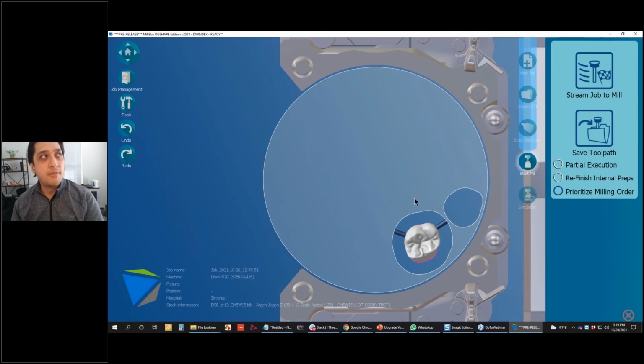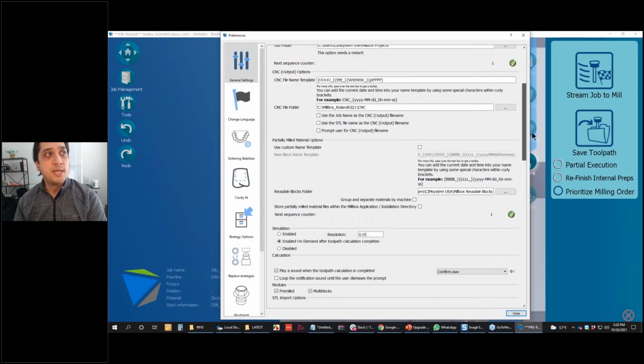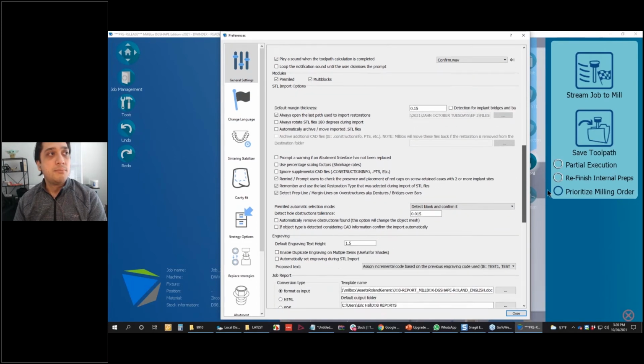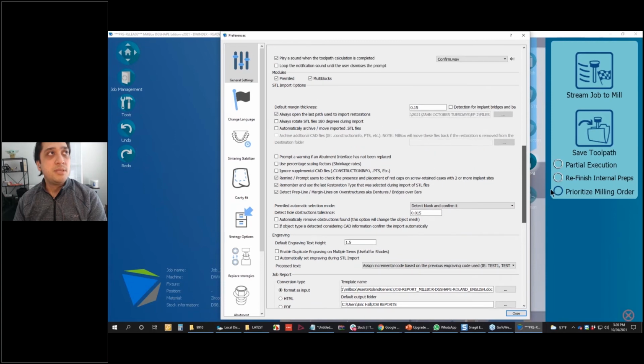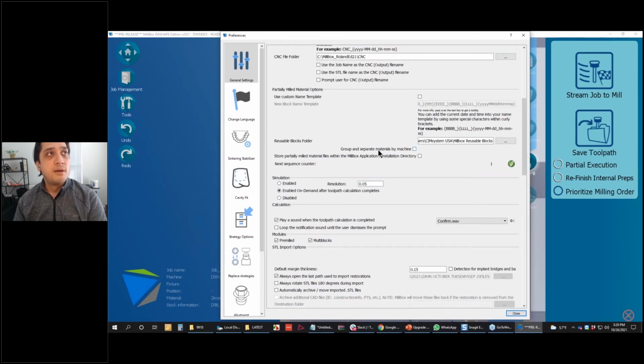One other thing that I didn't quite show there, and this isn't anything new in terms of MillBox, but in our settings, we do have a setting under the general settings area that will allow me to also show the positions of previously nested parts. So I'm just looking for that right here. There are two different options we can do.